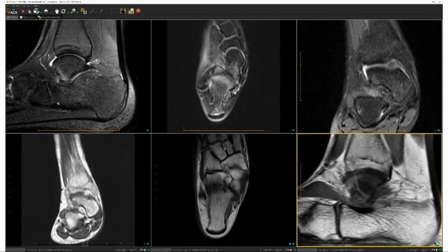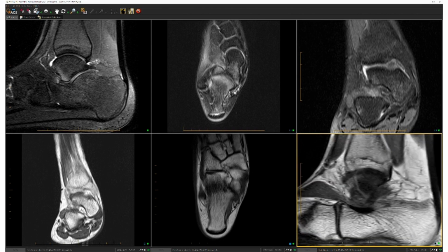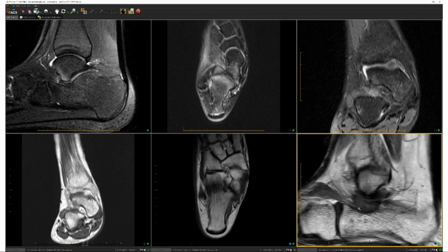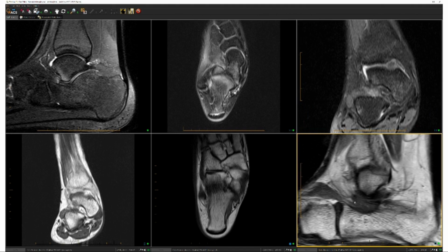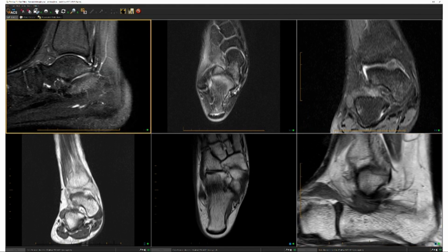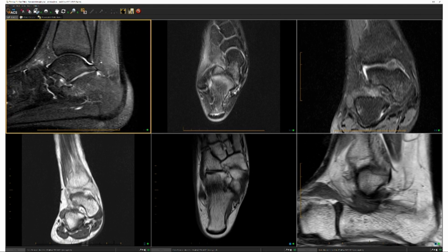Moving on into that sinus tarsi, more anteriorly, I do have my talocalcaneal ligaments anteriorly, but dorsally, they're quite thickened and narrowed there, with some fibrosis and synovitis occurring. So this is alerting me. A lot of times I see this in patients who have pes planus, and we'll come back to that.